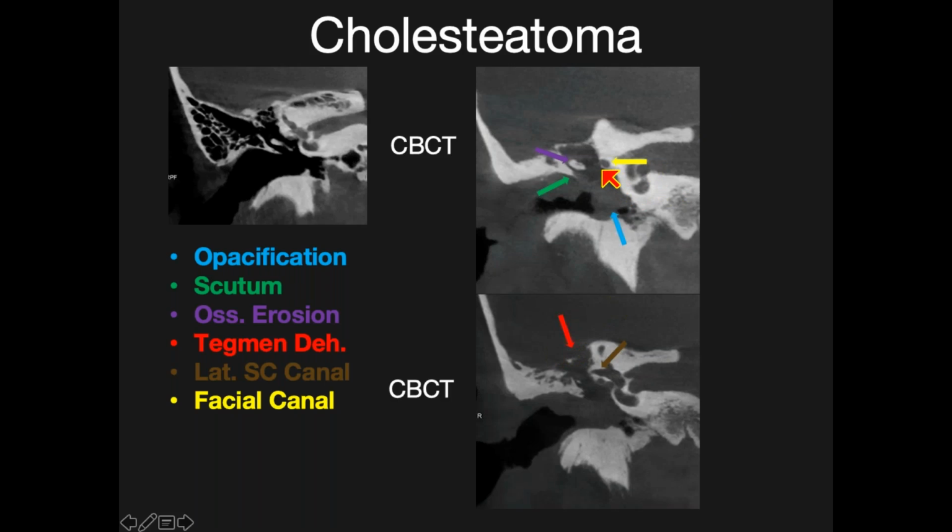Also note the thin wall between the lesion and the lateral semicircular canal, and it's only a matter of time before this patient develops a labyrinthine fistula.